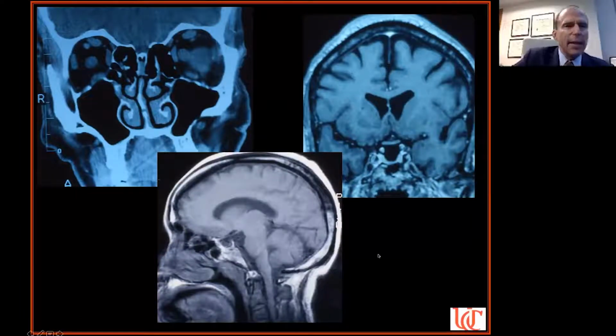Let's see. I think just some things to point out. Just normal and fairly normal anatomy. Hopefully everyone can identify the extraocular muscles, the optic nerve. This image is a CT scan. You see the nice white bone. What's this? In this image, the person is just rotated slightly.